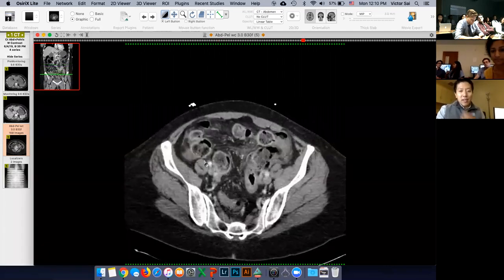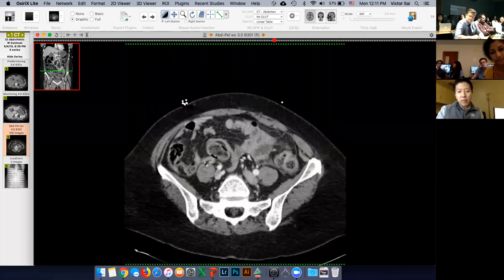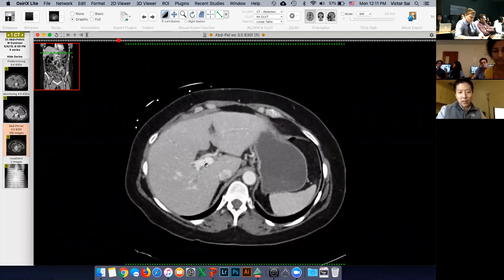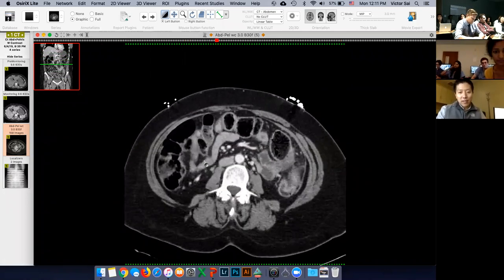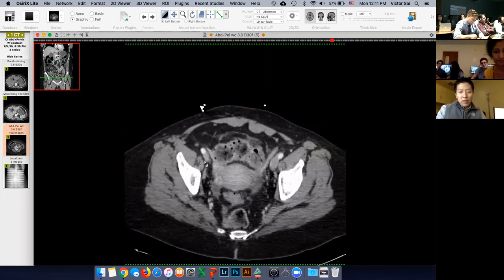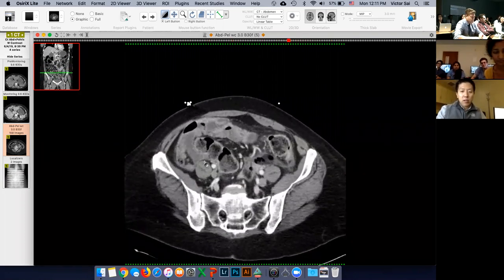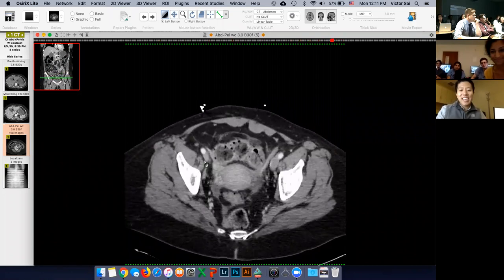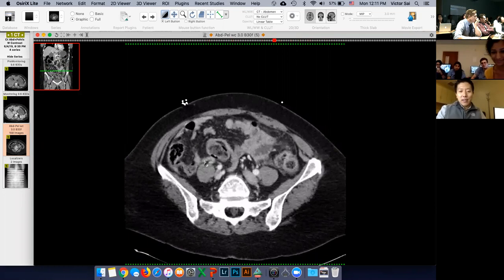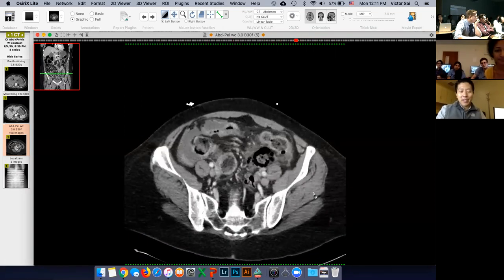Now, this is the second case of colitis. I'll tell you that this was also called infectious or inflammatory by our more senior resident. We have residents if you wanted any volunteers. Well, what's the most significant finding here? Anybody?